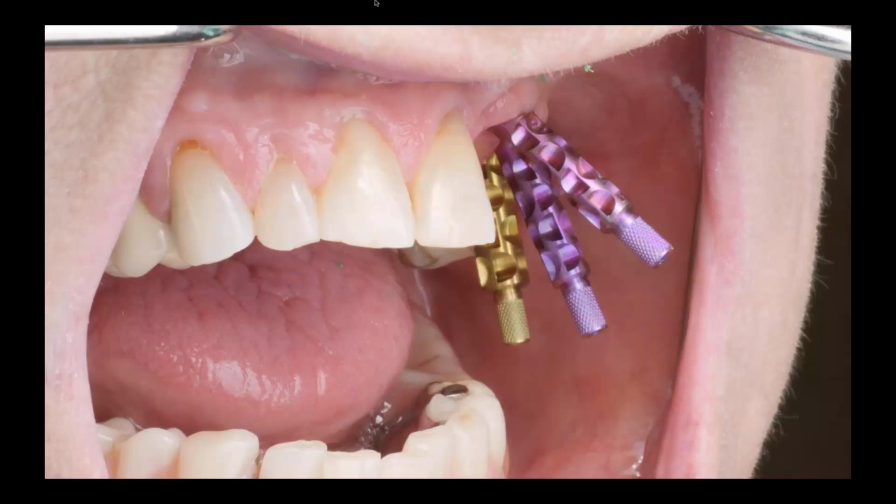So when I see something like this, I think of two failures. One is obviously the surgical placement. But number two is, how did you develop an idea of where the implant should go in the first place? Was it you just looked and guessed, which when we're doing freehand implants is essentially what we're doing, or let's say you did it guided and you still had a malposition, then how did you come up with that guided implant position in the first place?